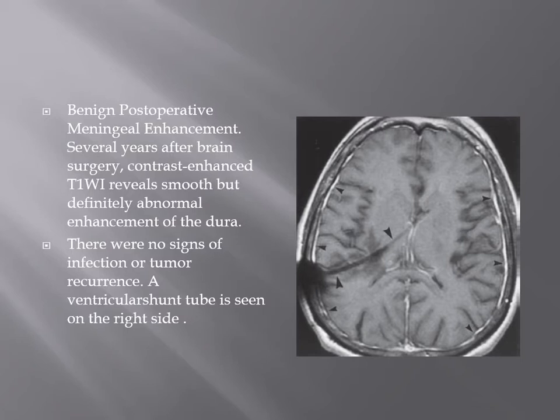This T1 contrast image, like this case, shows benign post-operative meningeal enhancement several years after brain surgery. Contrast enhanced T1 reveals smooth but definitely abnormal enhancement of dura.